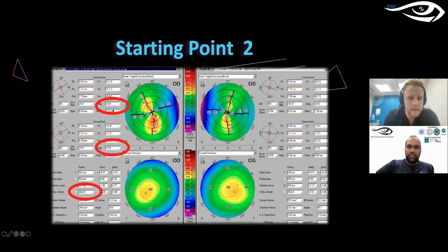So you can see there the axis was, well, that's the flat meridian, 25.9. Where have you got your steep here? Anyway, if you know that the flat axis is 25.9 here, you can almost just add that to your 90, and you've got roughly 120 there. So you know the steep axis is the opposite. It's something I find useful.